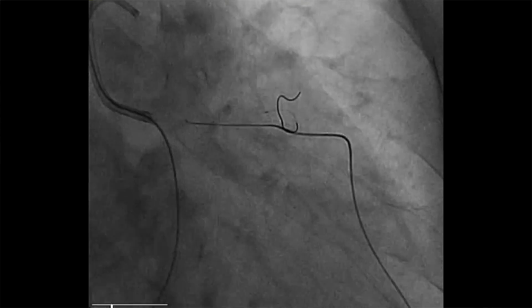The first type of large vessel perforation we want to talk about is the knuckle wiring extra plaque stenting perforation. When we do a knuckle wire, the wire is traveling down the extra plaque space, the subintimal space. And there's a big plaque volume, sometimes calcified, true lumen vessel stuff that's outside your stent.